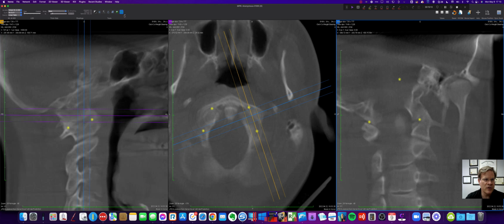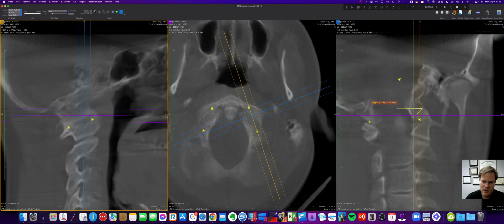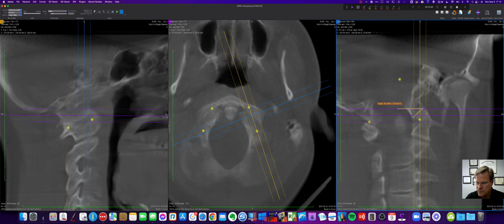But in order to do the adjustment, the way that Dr. Blair showed us how, we need this angle here. So here's the right slope angle. We're going to make sure that that's straight. Good. And then we're going to come over here. Now I can measure what Dr. Blair would do, is measure the convergence, the posterior 1/3 of this joint, which is about all we're seeing in this particular case. This is the opposite side convergence angle. So here's the right slope, here's the left convergence.